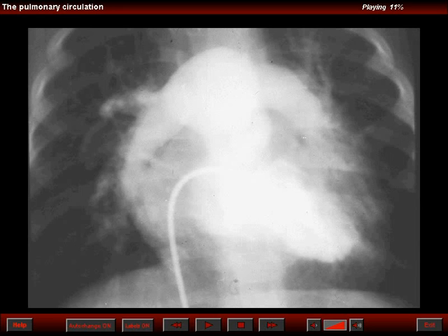A pulmonary angiogram following the injection of the right ventricular cavity, which is anatomically a left ventricle. Note its smooth inner outline. It shows the medial position of the pulmonary trunk, which branches into a right and left pulmonary artery.